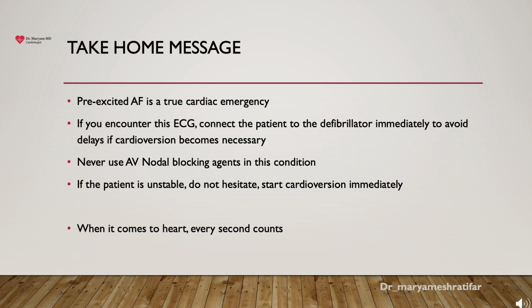The take-home message for this ECG is that pre-excited atrial fibrillation is a true cardiac emergency. If you encounter this ECG in the ER, connect the patient to a defibrillator immediately to avoid delays if cardioversion becomes necessary.